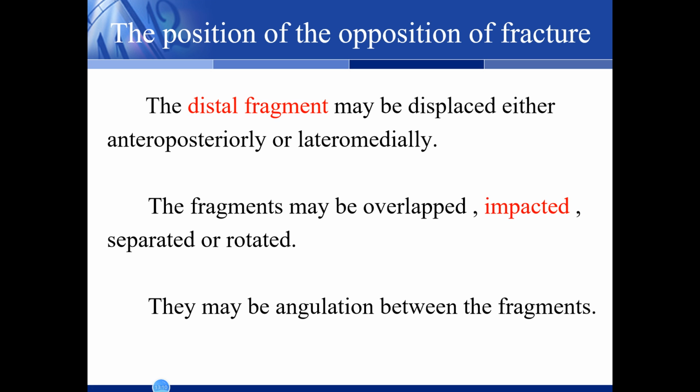Once a fracture is identified, one must pay attention to the position of the distal fragment in relation to the proximal fragment. So when the fracture happens, we should pay attention to the position and opposition of the fracture.